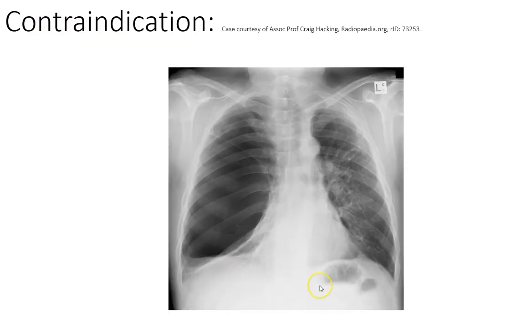The next film. Okay, so this isn't a perfect example of this contraindication, but I'll show you what it shows anyway, just because it's such an extreme example. It's rare that you would see one like this.